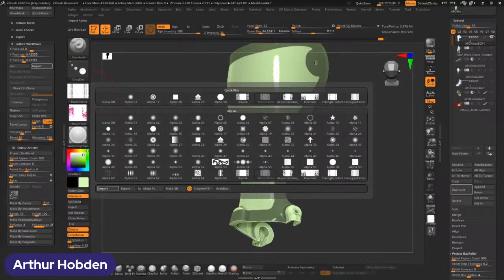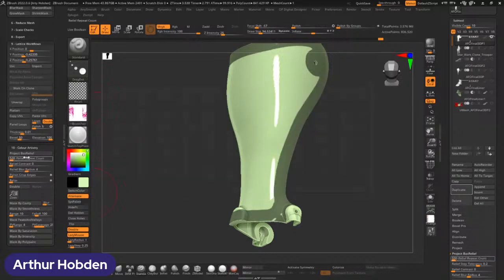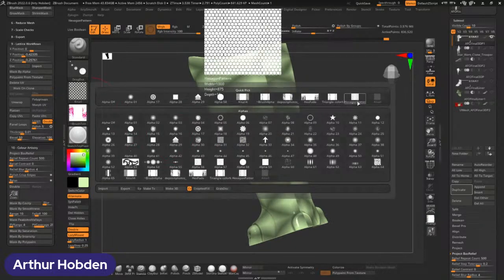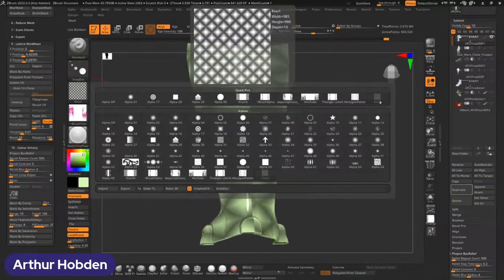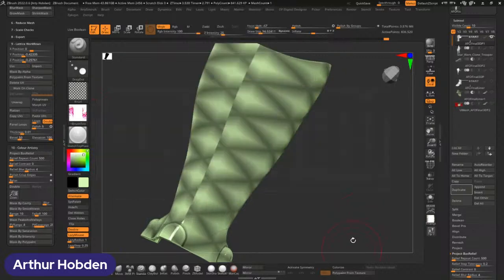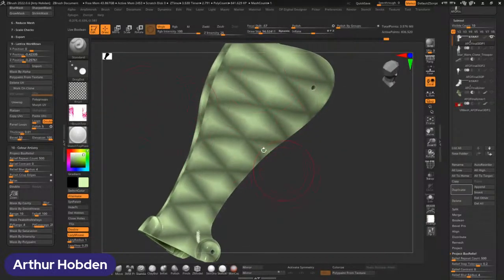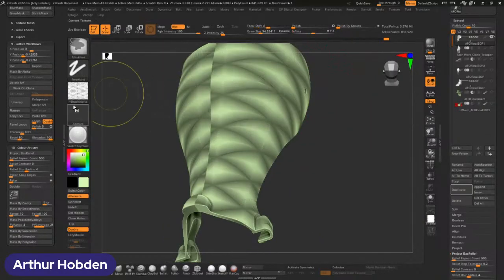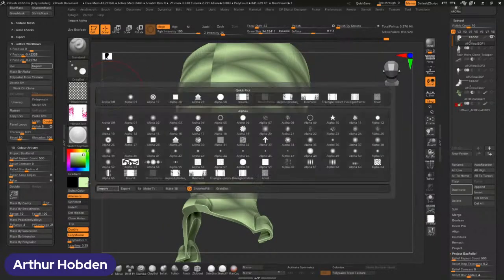Where are my alphas? Where is a good example of this? Okay, so here we go, finally. Sorry about that. So if I UV mask by alpha, this image you can see is really big and unmapped. So you get this weird seam, and all of those are coming in really large. And so, if we inflate that, we get a different result. That first one didn't work at all.